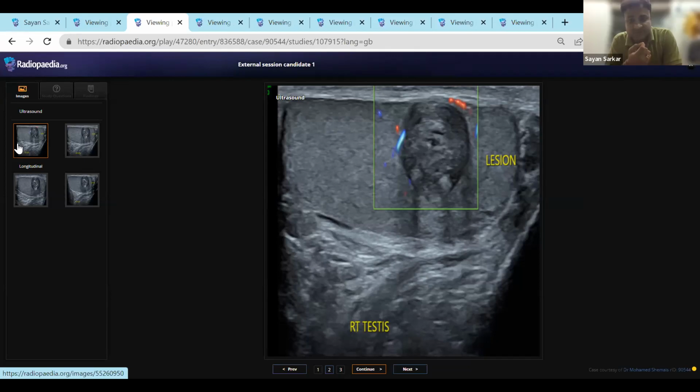But you said just now it's a non-aggressive looking entity, right? Yeah, but then burnout tumors are non-aggressive. You can ignore, I mean, maybe that will be later in your list of differentials. What are the other more likely possibilities? Other possibilities in a testicular lesion. Suppose it is just an incidental detection. The patient is not having that many complaints. Less likely rete testis also, but rete testis usually has that cystic appearance. Exactly. This is not rete testis.